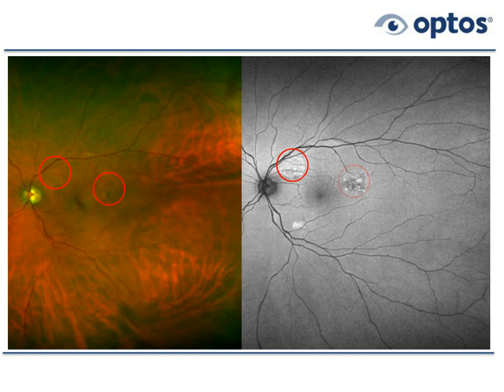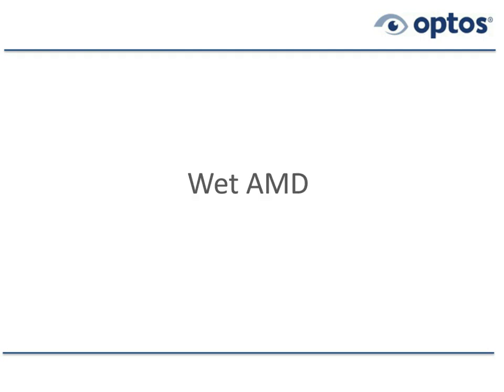Part of the lesion is hyperautofluorescent, and part of them, like that one temporal to the fovea, have some hyper and hypo zones. So some of the tissue is dead, some of it is metabolically active. So central serous is a common condition where we actually see lots of abnormalities on autofluorescence.